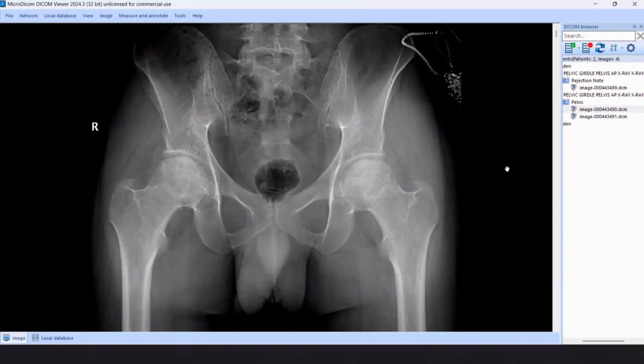Okay, let's conclude. What did you say now? This is the abdomen of the patient. On the right side, you should check the gallbladder. Is there any gallbladder stones, or something like this in young age? So you should suspect sickle cell anemia. If we have splenomegaly at the left side, splenomegaly can explain Gaucher disease, sickle cell anemia, also myelofibrosis. Sometimes the spleen, autosplenectomy or splenic calcifications can suggest also sickle cell anemia.